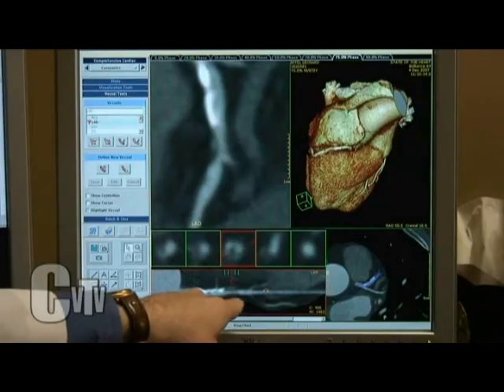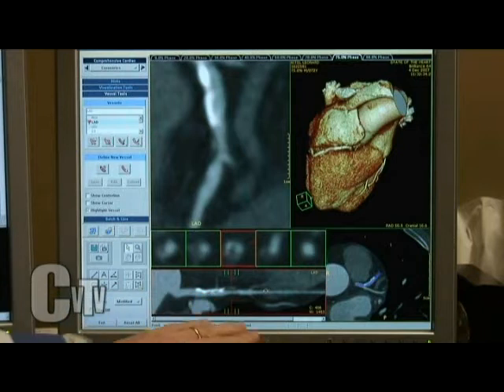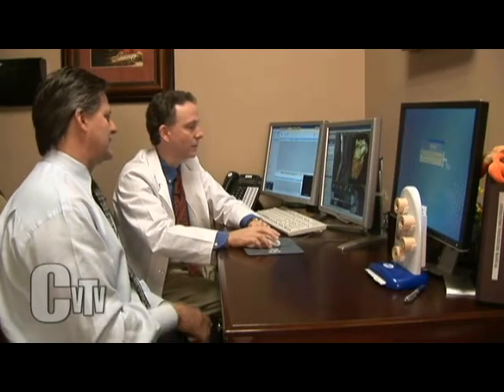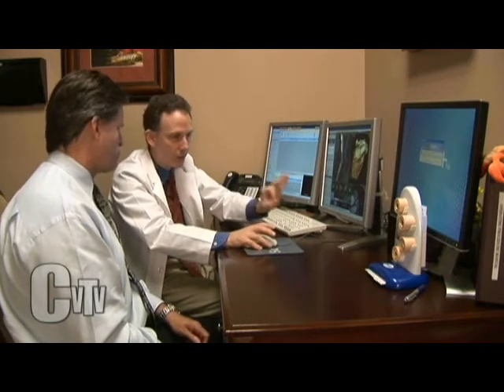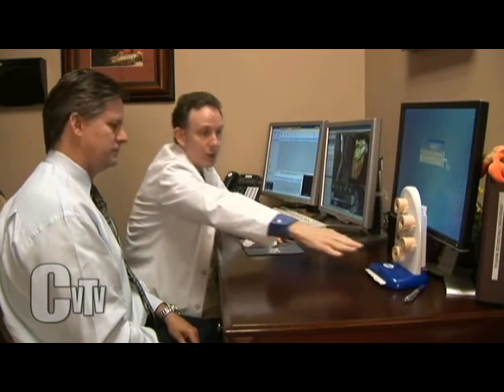The first study we did, this was about a 60 or 70% blockage. Now we're down about 40% in the span of 18 months. And appreciate this thing's been growing there for decades. So why would you not take that person to the cath lab and put a stent in? Well, you know, we know now that ballooning things and stenting things and opening things up and bypassing things is really good to treat symptoms when you've got a severe blockage.